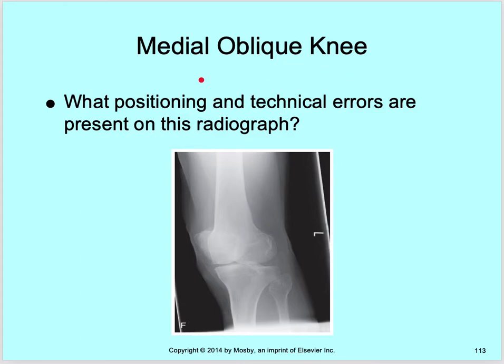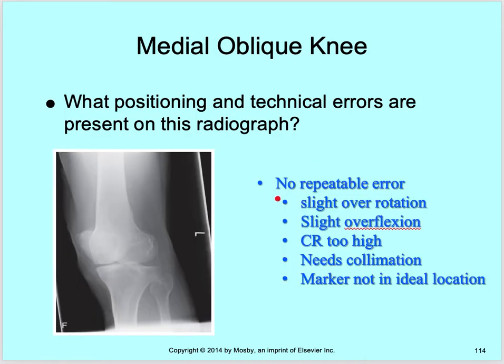Your medial oblique knee, what position and technical errors are present on this? So what you're wanting to see is, we talked about this joint space being completely open here. This patella to the lateral side of your femoral condyle. And here we've got no repeatable error seen. So there really isn't a repeatable error.